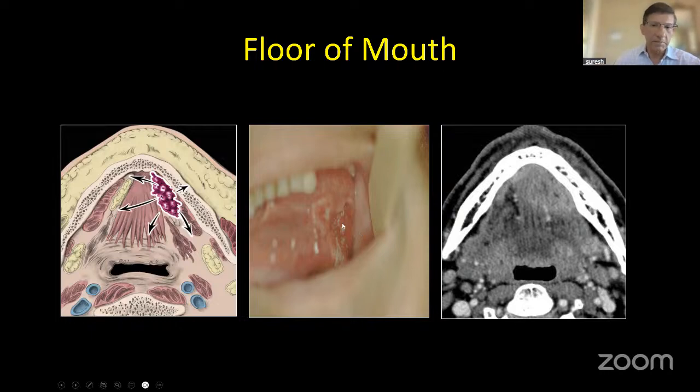So the surgeons can measure the tumor, but from their standpoint, they want to know the type of surgery options they can present to the patients. So is this a tumor that they can perform a wide local excision on? Is it a tumor where they can just take a little bit of cortex, or is this a patient where they have to take the whole mandible out? So this is an example of a tumor that's involving the floor of the mouth.